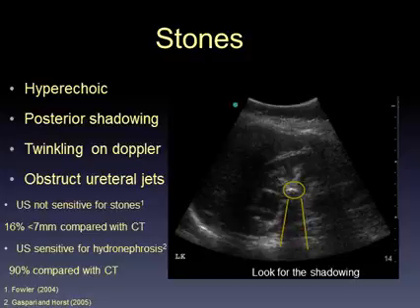Just put a note there to point out that, again, ultrasound is not very sensitive for looking at stones, in particular smaller stones. Whether this matters, whether these are clinically significant stones, is for another discussion. But just important to note that it's not so good for stones, but it's very good at looking for the hydronephrosis that the stones can cause.